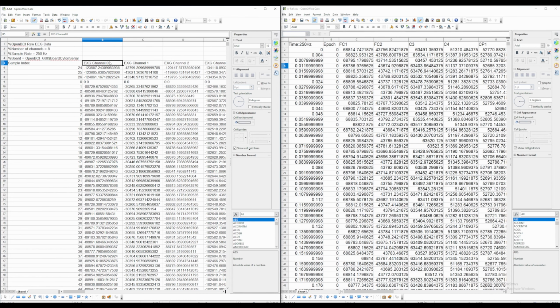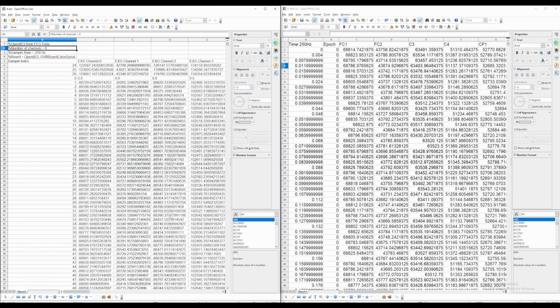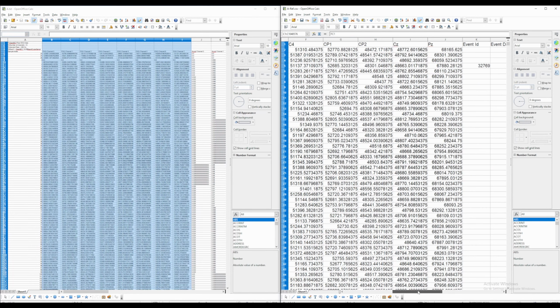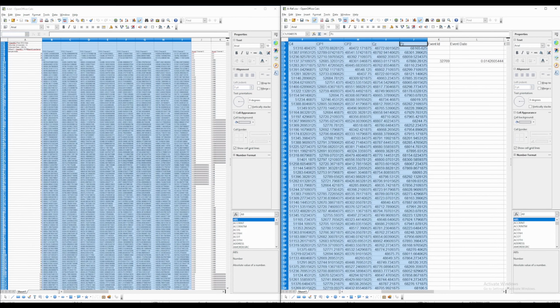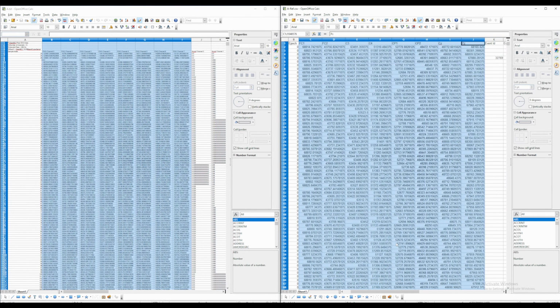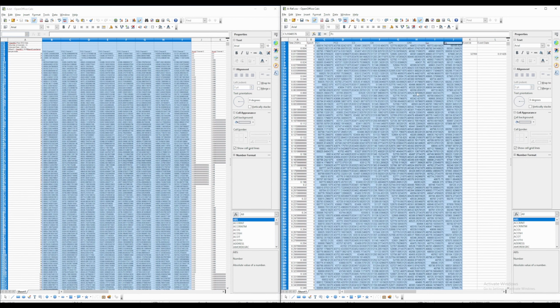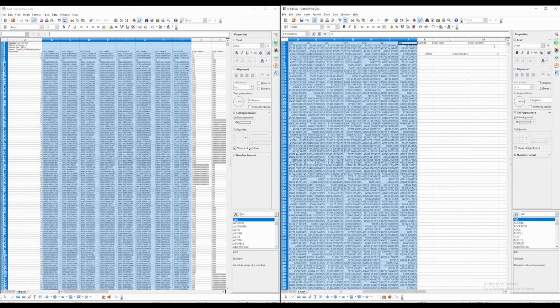All right, so both of these files are recorded using the same device. They're both recorded at 250 Hertz, and they both have 8 channels. So here we have 0 to 7, and here the channels are named after the head position or the scalp position that the electrodes are at, which is what's most common with EEG files. But here we also have 8 channels, 8 columns of data, plus the 3 extra columns that we'll just add the headers for. But other than that, the signal part of our data basically stays intact.